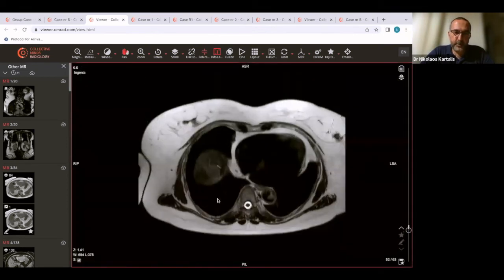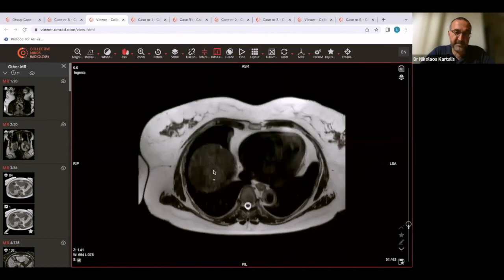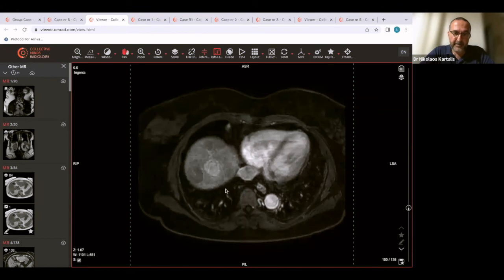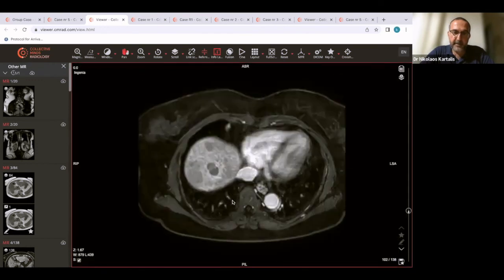These are the T2 series. We have the slightly hyperintense, the HCC. The others are probably isointense or hypointense on T2. On the late arterial phase, we have, apart from this arterial phase hyperenhancing lesion, hypovascular first and second ones. Again, we have a beautiful capsule, slight isointensity, and on the 3-minute phase, clear hypointensity for the other lesions here.